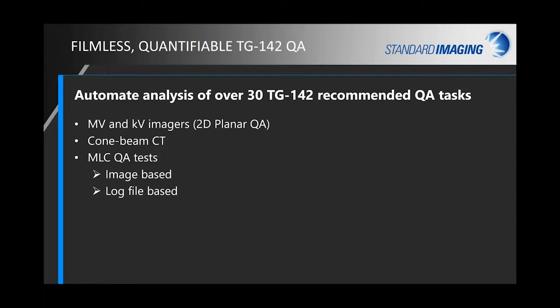Is it not sharing correctly? Apologize about that. Let me take a look. So basically, this is kind of the first screen with any information. The first couple screens were introductory screens anyway, just kind of talking about it. So I apologize about that, but we'll move along.